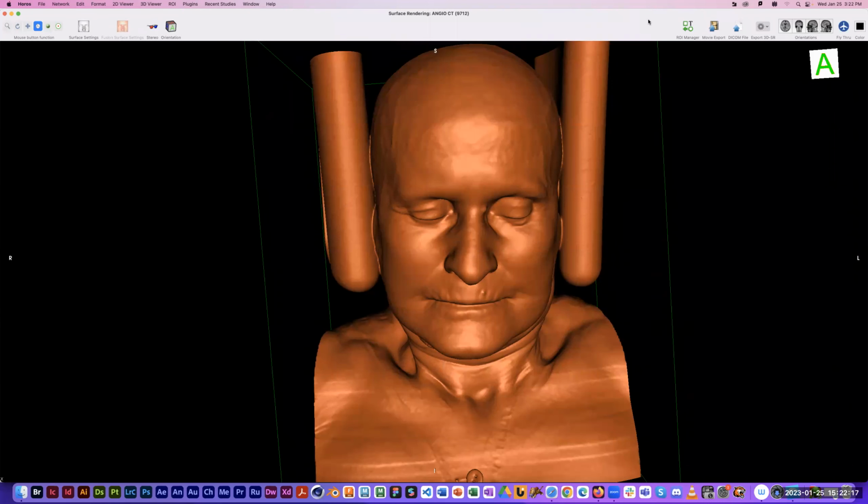I'm gonna move forward and demonstrate something you can do with volume models. Like I said before, I think there's more you can do with them to play with. I just want to call your attention, if you hadn't noticed, in my courses, I posted a copy of your first assignment, which is really just a class exercise. And one of them is simply to export a JPEG of a rendering of the surface. I think I put some criteria in there, like I think I wanted 2 models, like bone and skin or something more transparent. So there's some parameters, but all I want for that is just make sure that you actually come through and play with the surface model.